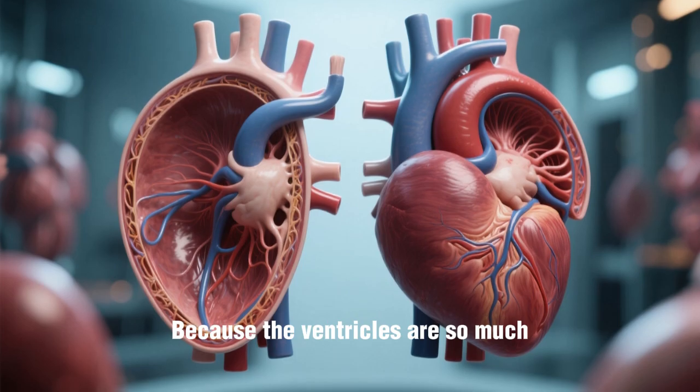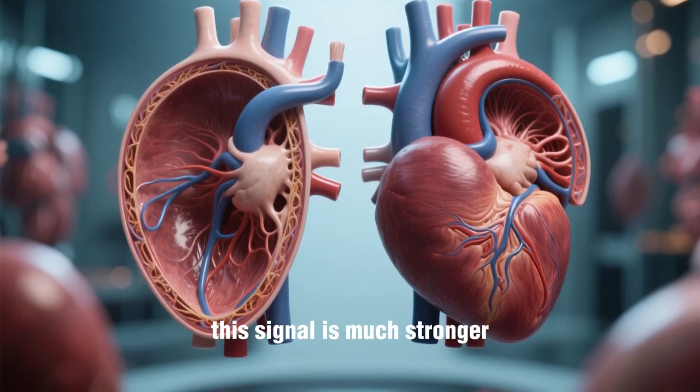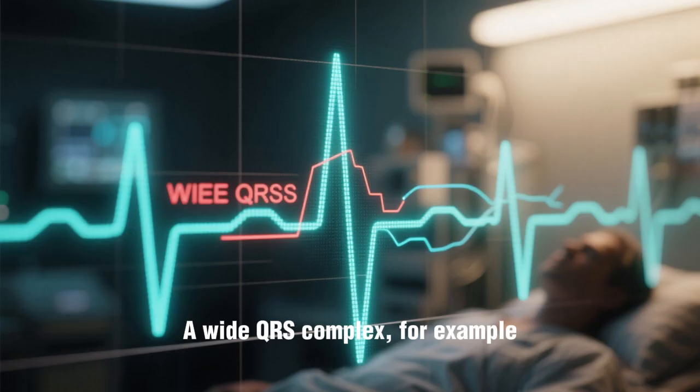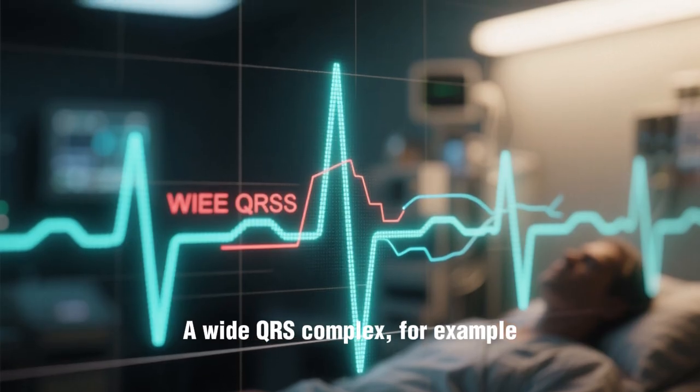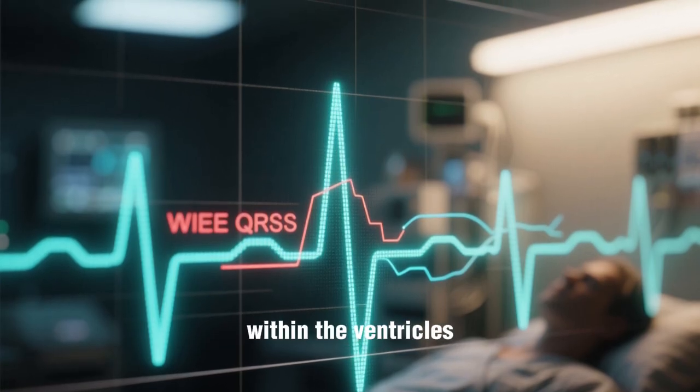Because the ventricles are so much larger and more muscular than the atria, this signal is much stronger, which is why the QRS complex is so prominent. A wide QRS complex, for example, might indicate a block in the electrical conduction within the ventricles.